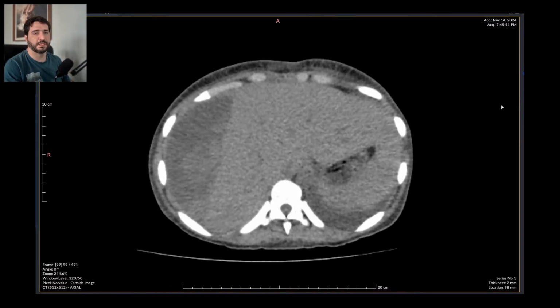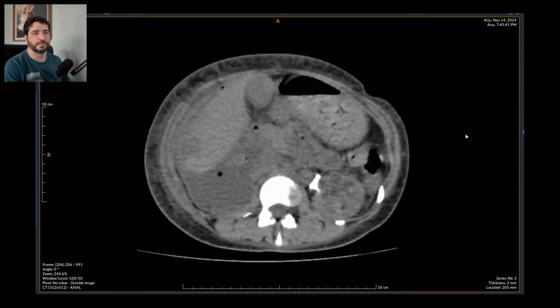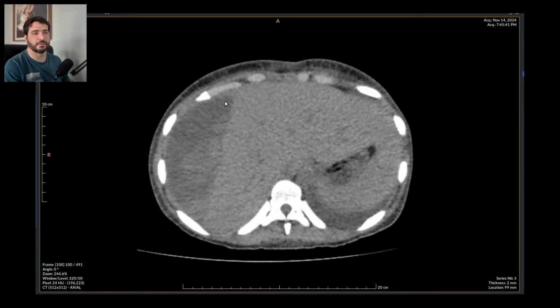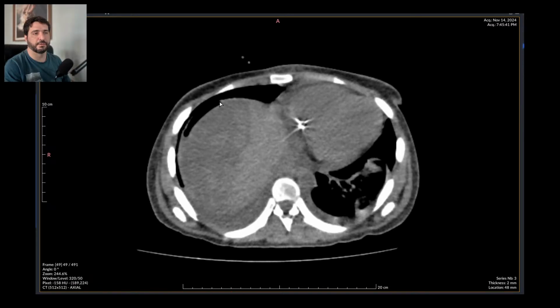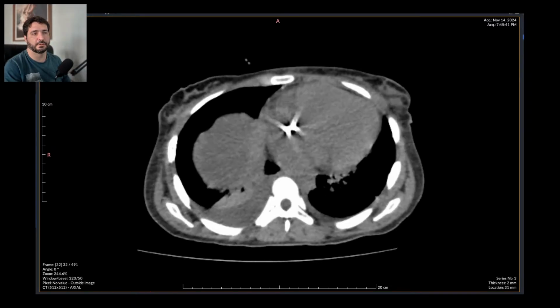This could even be a case of a diffuse liver infarction due to severe acute abdominal infection. It could lead to thrombosis of the portal vein and infarction of the liver, just like that. And liver infarction may have an air fluid level, just like that.